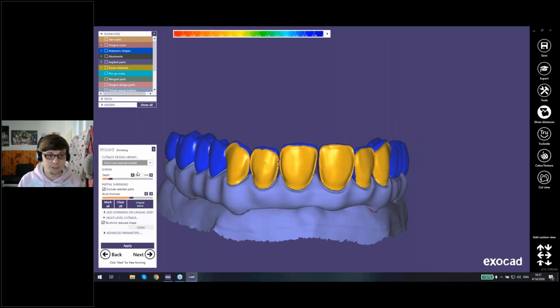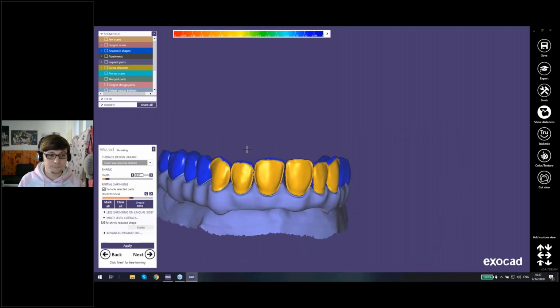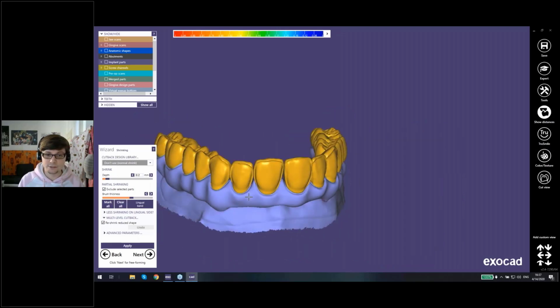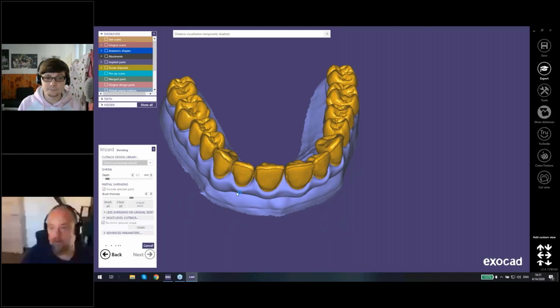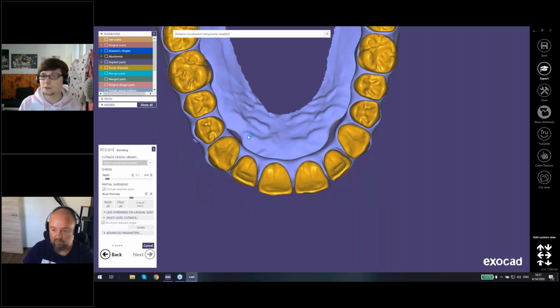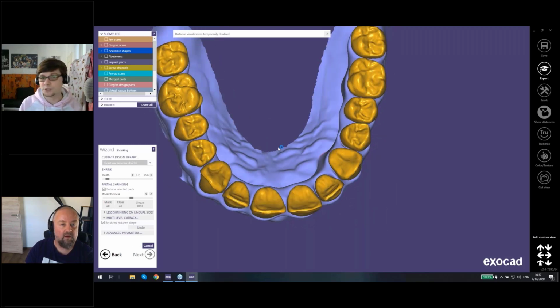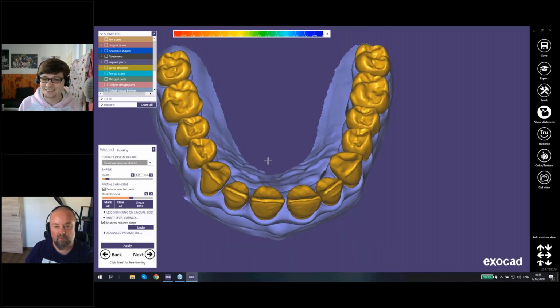And if I reshrink the reduced shapes and now select maybe 0.2 for a glaze material, and then I say clear all, I can just again say apply. And now all of them get shrunk just a little bit, just 0.2 millimeters. You see you have your room for your glaze material, but you still get your complete anatomic shape. Maybe 0.2 is a little bit much, I went too high with this parameter.